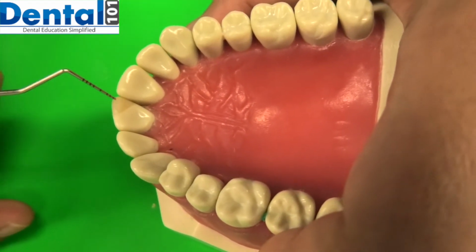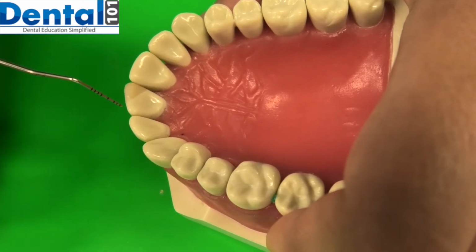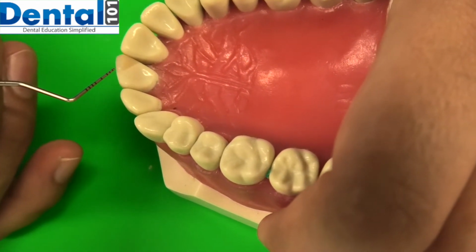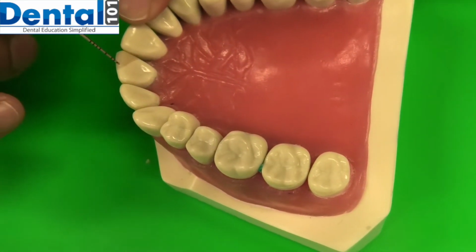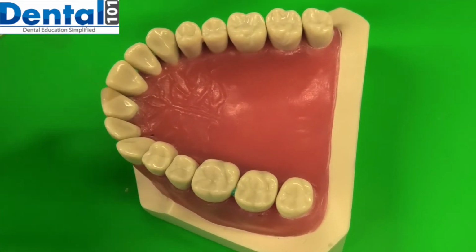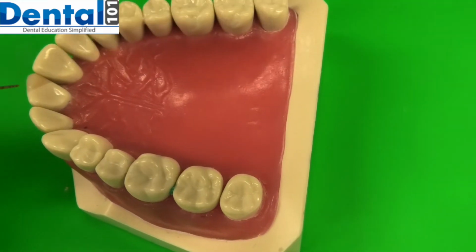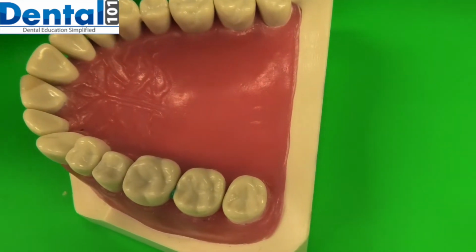On the incisal surface, there is a porosity I can see, which also needs polishing. Again the same thing. Because of that same porosity, our mark was deducted in the first point, and according to the second point, our mark will be deducted again just because of the same mistake.